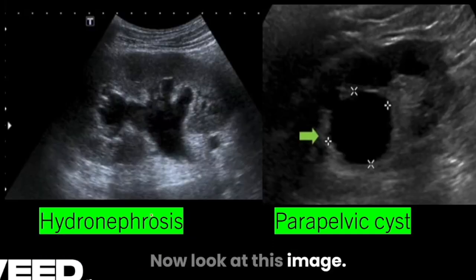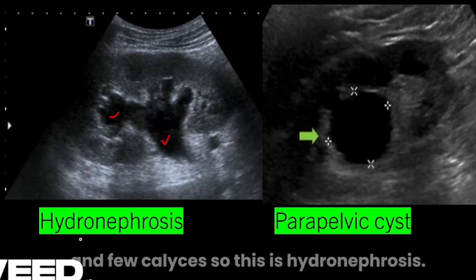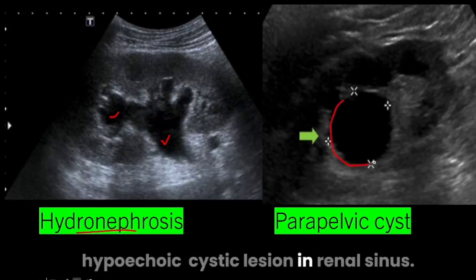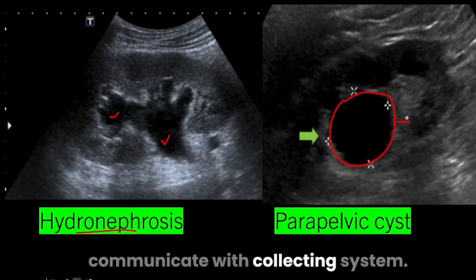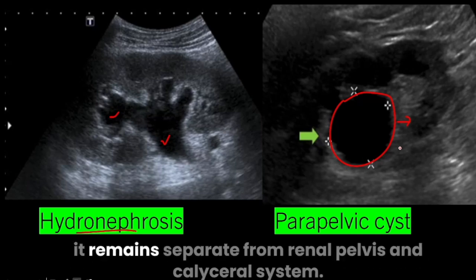Now look at this image. In the first image, there is a dilated renal pelvis and a few calyces. So this is hydronephrosis. In the second image, there is an anechoic cystic lesion in the renal sinus. This structure does not communicate with the collecting system. Though it is present in the renal sinus area, it remains separate from the renal pelvis and calyceal system.